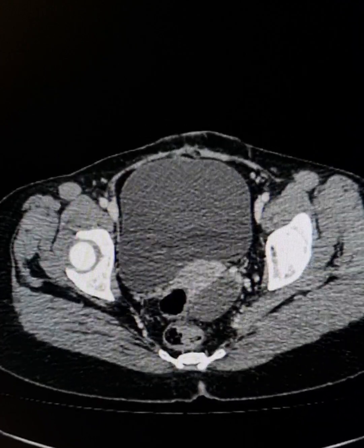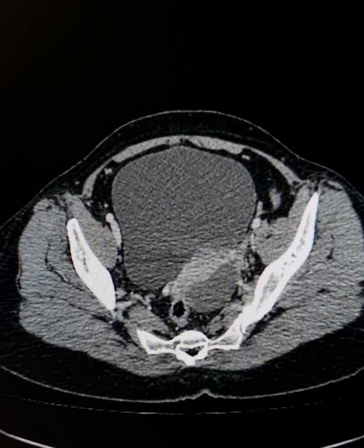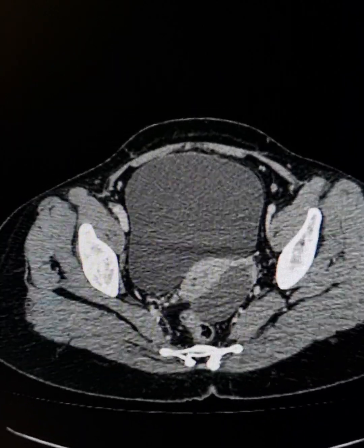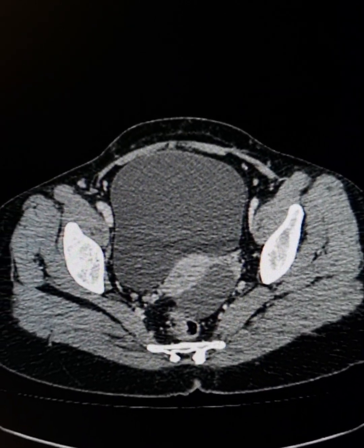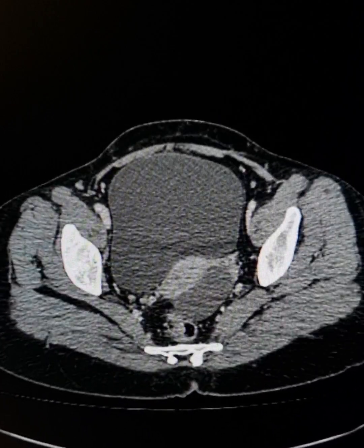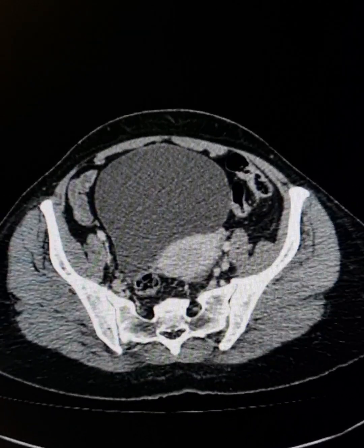By walls I mean that they don't have enhancing walls. Obviously they are encysted and there has to be a wall around them, but the walls do not enhance. And these are the differentiating features from the complicated cyst, from the endometriotic cyst, or from the malignant cyst.